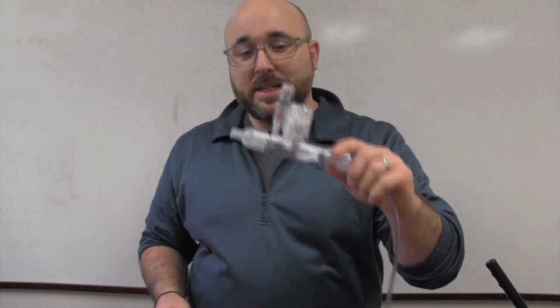Yeah, that's significant. So that will also loosen secretions, because anytime you're going to inflate airways, you're going to loosen secretions. So cool device, EasyPAP, AccuPAP, PAP therapy is what it's also called, positive airway pressure therapy. It's a really good tool that you'll see. It's got to have a gas source though, so that is one limitation that it has.